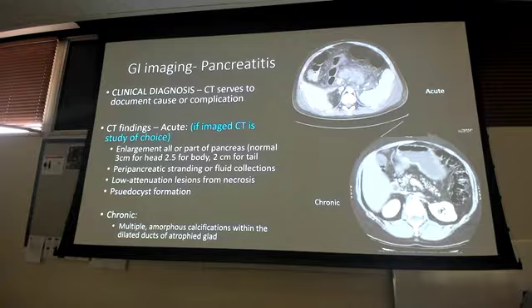One was your physical exam findings. The other one was your patient history. Not just the most common, so surgical type stuff and when that surgery was, but also the review of systems. What are their bowel movements like? Are they still passing gas? Are they not? When's the last time they had a bowel movement or passed gas? So there are clues within there that help you go, this picture definitely shows dilated bowel, I know it's one of these things, I know something's going on. From the picture, is it small or large bowel? That's something you should be able to pull from the picture. But then if we go small bowel for sure, ileus or obstruction, give me some information. Yeah. Good. What else?